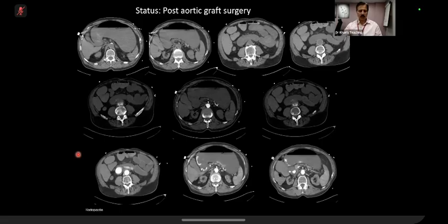So this is a case from Radiopaedia, where you can see this high density within the lumen. So this is the duodenum, which is high density. And on early arterial phase, there is a bit of blush inside. And then on delayed phase, there is more active bleed.